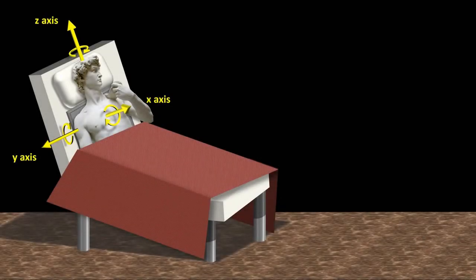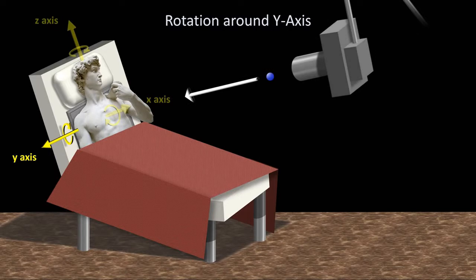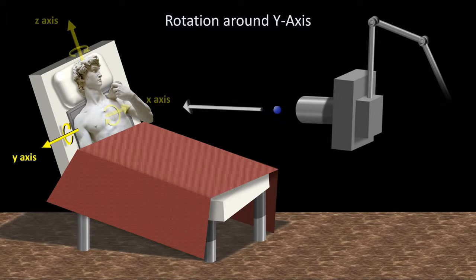The second type of possible rotation, which is around what I've labeled the y-axis, isn't usually a consequence of the patient being rotated relative to both the beam and the film plate, but is rather a consequence of the X-ray beam being rotated relative to both the patient and the film plate. That is, instead of the beam of X-ray photons being directed perpendicularly to the frontal plane of the patient's chest, they are directed upwards. Although not common, when this happens it can be due to human error in judging the angle when the X-ray source is positioned.